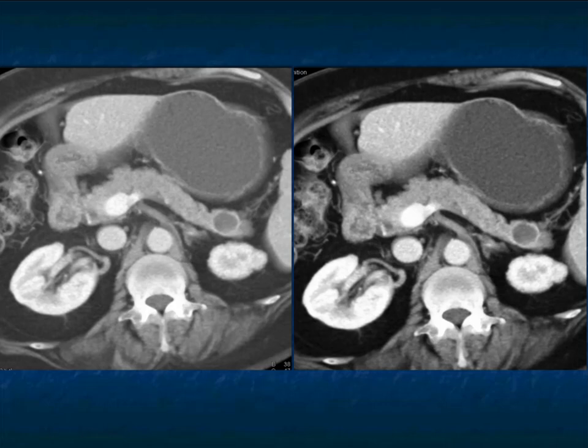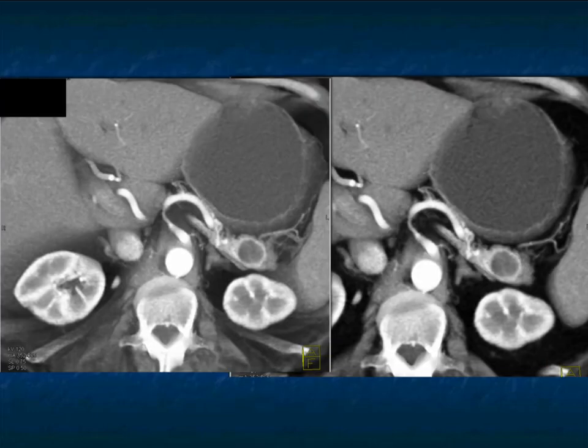The rim enhancement says, okay, this is not an IPMN. Also, the fact there's no dilated pancreatic duct. Could this be an MCN? Yes, in theory, location, maybe patient age, but MCNs typically don't have that rim-like enhancement, and serous cystadenoma is very much the same story. This is enhancement. It's not a vessel draping.